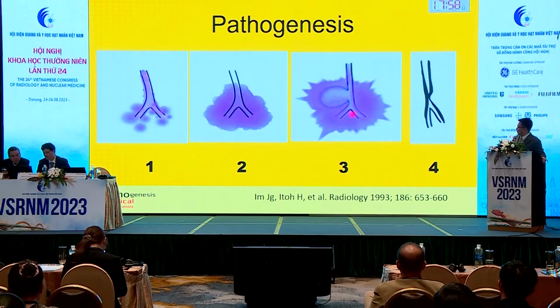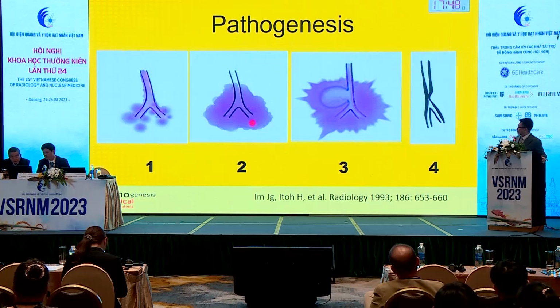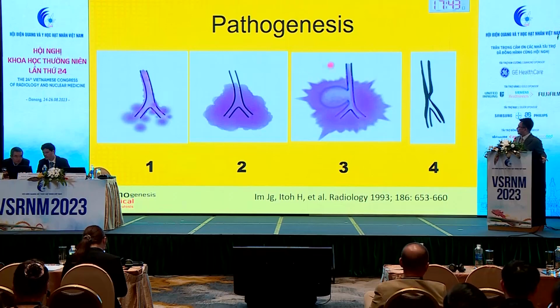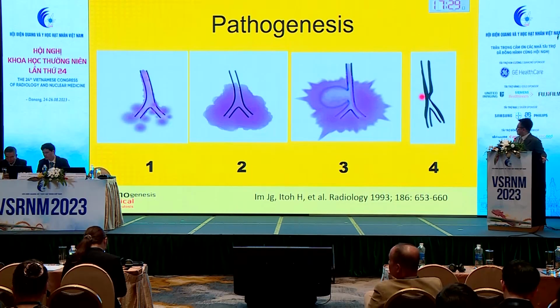After that, it will advance into a granulomatous process. The fibrosis in the granulomatous process will retract the lesion from a triangular wedge shape into a round one. It will be more round and have spiculated nodules. It will also cause rupture of the central bronchus, so you can see a central cavity within the lesion. The final stage is fibrosis only, the stricture of the bronchus. This is permanent damage, with no recovery at this stage.